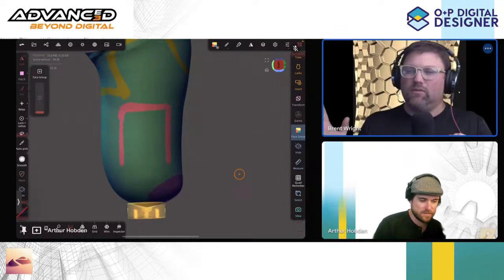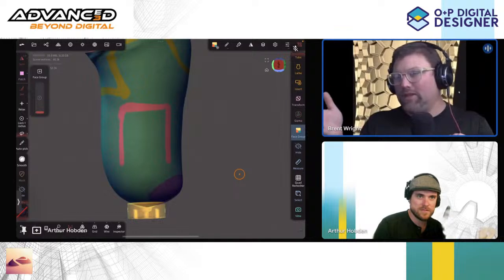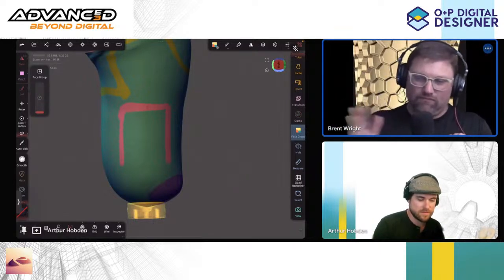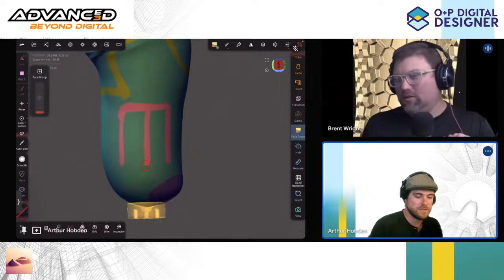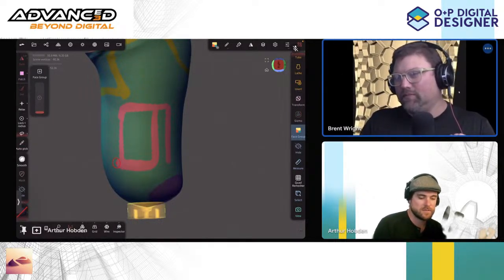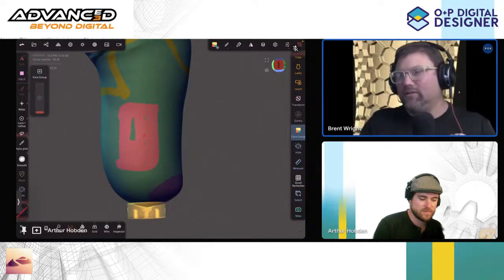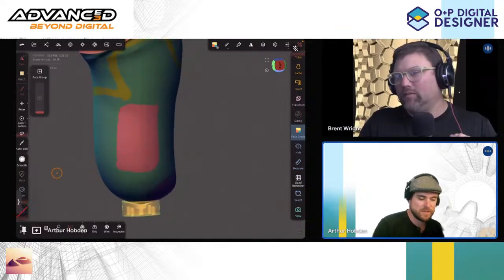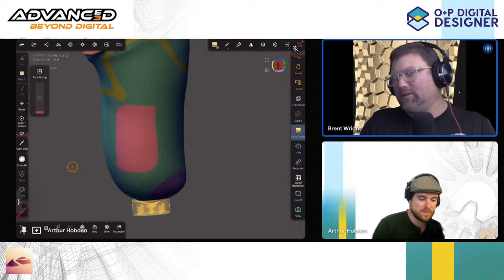Okay. So if you take that line on the right side of the screen and move it back here, a little bit further forward. There we go. Yep, something like that. And then right next to that, you're going to have a different color. Same length. On the posterior or anterior side? No, right next to your pink, to the right of the pink.